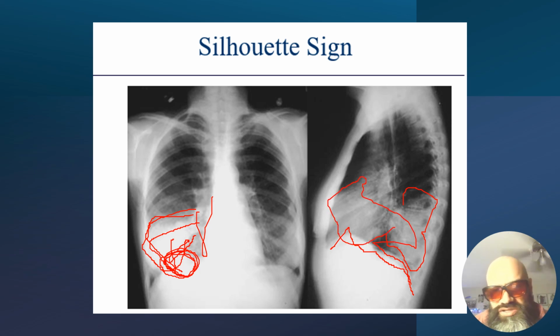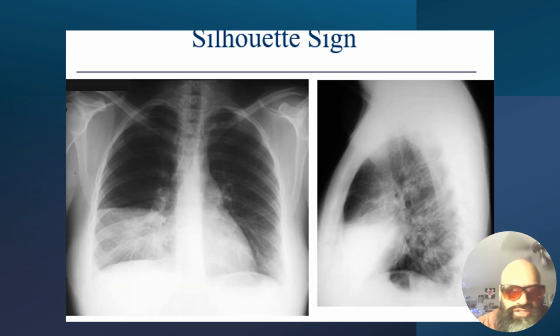Here is your heart, here's your retrosternal region or substernal region. Sometimes with COPD, this area is more rounded like a barrel. And here this is completely making the spine appear white in this area as well. We'll go over that shortly.